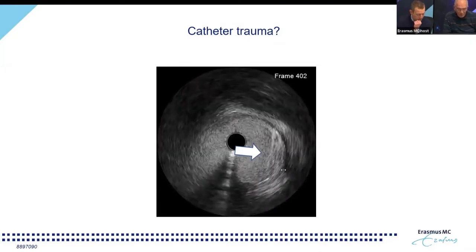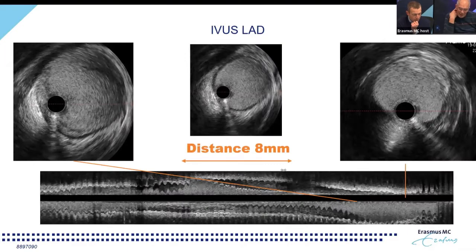All right. So we continued here. And then we were puzzled, because we knew that this was damage due to the catheter. That was this small erosion-like appearance of the ostial left main. And there was a hematoma. So in a patient that would enter your lab for an elective case, stable angina, you would say, well, 1 + 1 is 2. Those are very unlikely to be two different pathologies. This has to be related.